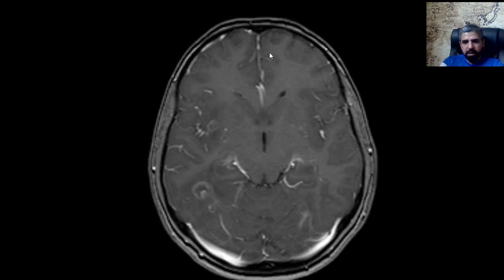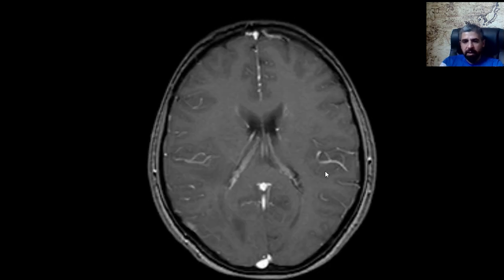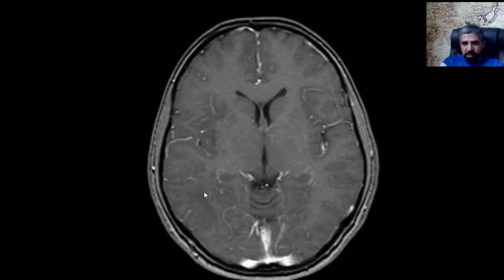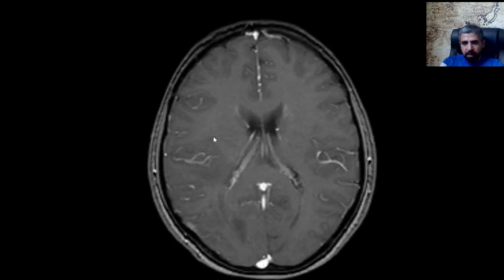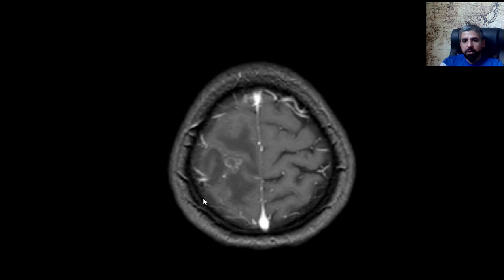And you can see this is a T1 weighted image. The CSF is black, the gray matter is dark, indicating this is an axial T1 weighted image. However, the cerebral venous sinuses are white, and the cortical veins are white, indicating this is a post-contrast image. You can see these lesions are showing peripheral enhancement with some central nodularity here, here, and here, another one, and another one possibly here. There are multiple ring enhanced lesions with central nodularity.